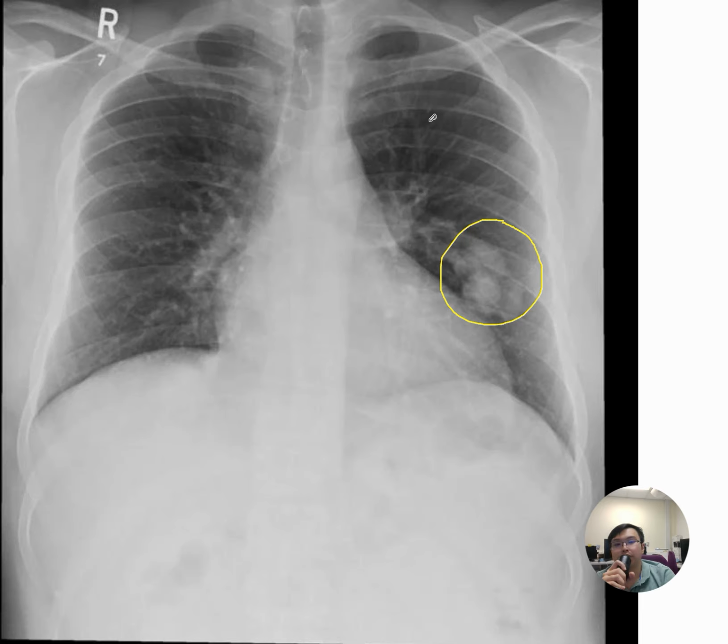So we need to consider the possibility of HHT whenever we see a similar lesion like this, which is like a vascular pouch with apparent communication with the pulmonary lung markings, and usually such vascular shunting effect will result in dilatation as well as tortuous course of those vessels as well.